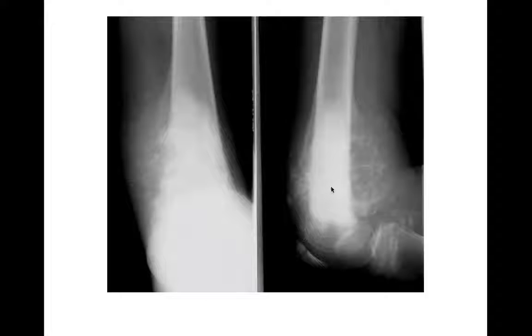We saw this one earlier. This was the osteosarcoma, again, just showing us the Codman's triangle and the sunburst, in the areas of hair on end periosteal reaction, and the sclerotic lesion in the distal femur. Very aggressive looking osteosarcoma. You're not going to mistake this for a non-aggressive or benign periosteal reaction.